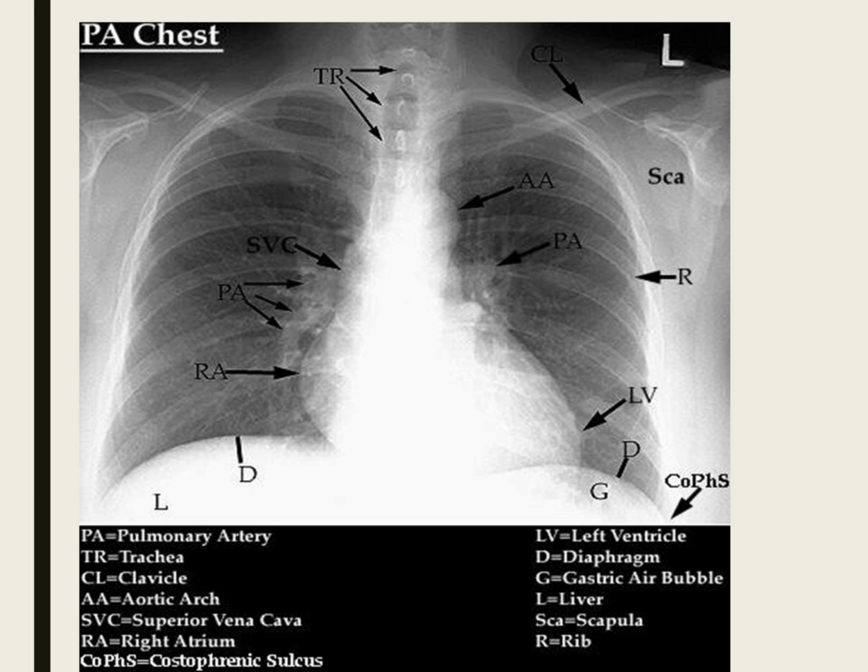If you don't, you can miss the retrocardiac infiltrate. Remember, there's lung behind the heart. If somebody has a lateral film, you will see that infiltrate, but on an AP or PA, you might not. So, other interesting things: aortic arch, pulmonary arteries. If this stuff is really full here, kind of almost consolidated.